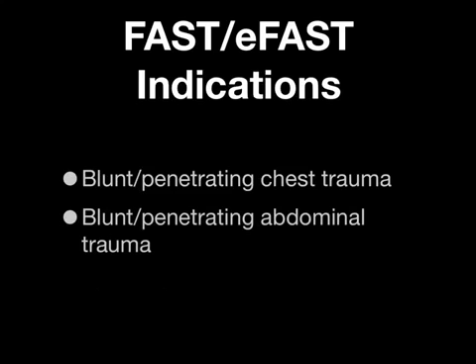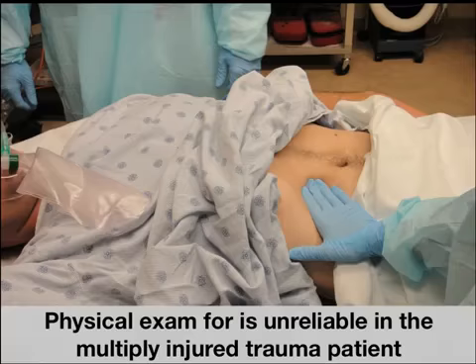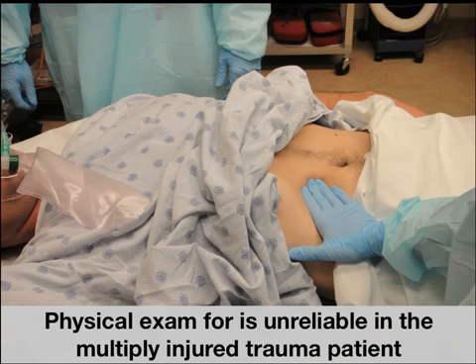Indications for performing the FAST or eFAST exam include blunt or penetrating chest trauma and blunt or penetrating abdominal trauma. Physical exam for the detection of internal hemorrhage is unreliable in the multiply injured trauma patient, and that's why the eFAST exam has become so popular.